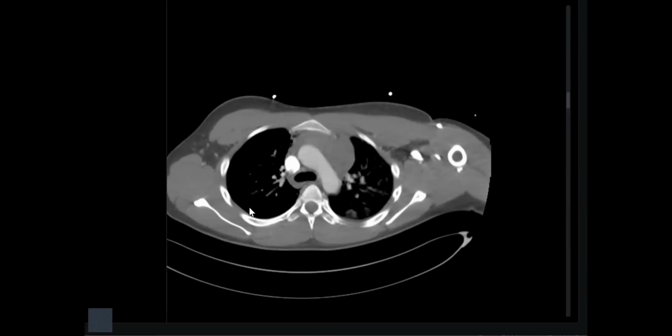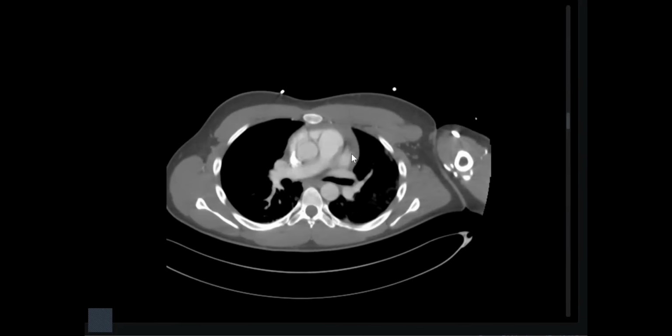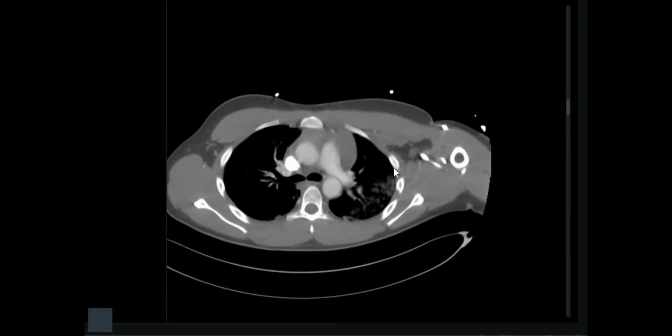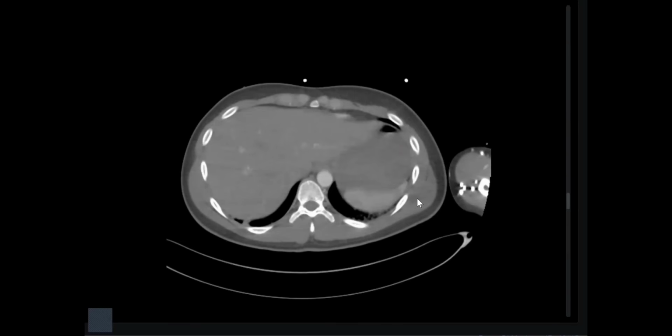Also, I will look at the tracheobronchial tree in the lung window for any rupture or pneumothorax formation, and the branching. I am not getting any extravasation of contrast in these images. No extravasation. And no thoracic duct injury: there is no fatty density for any thoracic duct rupture.